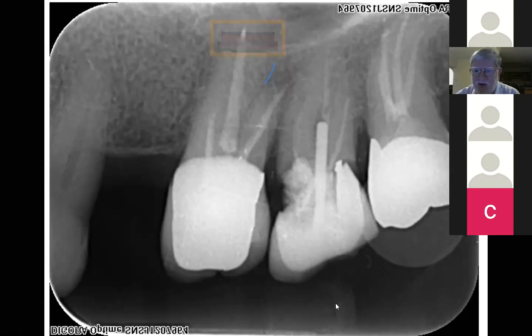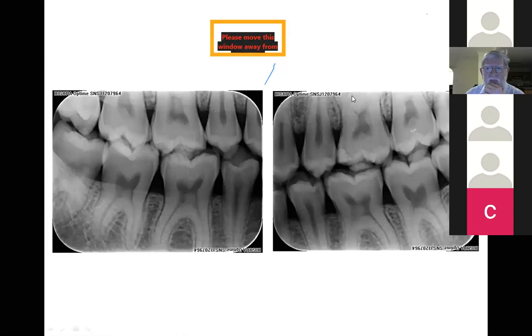Here, there's a tooth, it's had just about everything thrown at it. It's had endo, it's got a post, it's got a crown on it. It's in poor shape. It's extremely weak. And it is a tooth for the bucket. You need to take that tooth out. Really poor prognosis.